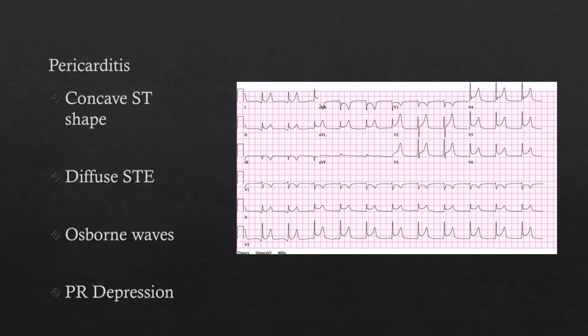but the ECG right off the bat can clue us in. So that diffuse happy face ST elevation should cause us to pump the brakes and ask a couple more questions and make sure that it is truly that STEMI patient versus something else, which in this case it is. It turns out to be just a case of pericarditis.